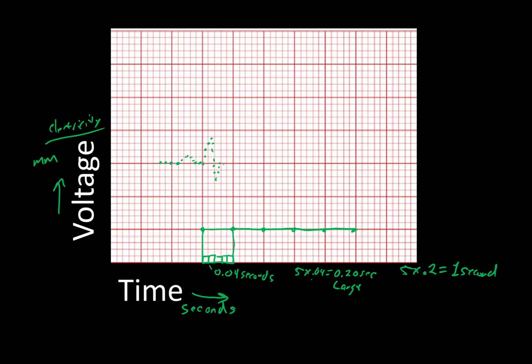And it comes up, and now no electricity, no electricity. Well, now it's measuring more, and it's kind of traveling towards it, but not nearly as much in one single instant. It's a little bit less. And then no electricity flowing. That is how you create an EKG rhythm, how you create a strip.